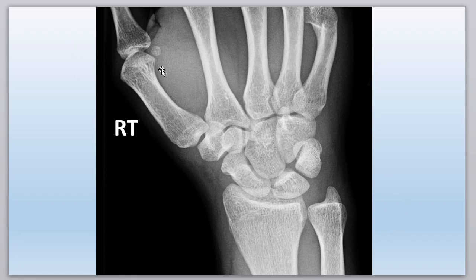So this guy's got a little bit of malposition here, but you see a nice sesamoid bone here. That's not a dislocation. They might have had their finger or their IP flexed a little bit. Okay, let's check for fractures. These look fine. That's fine as well. It's just kind of funky the way this patient was positioned. Okay, let's look through here. Looks good. Don't see any fractures of the ulna. There's a nice styloid process there.